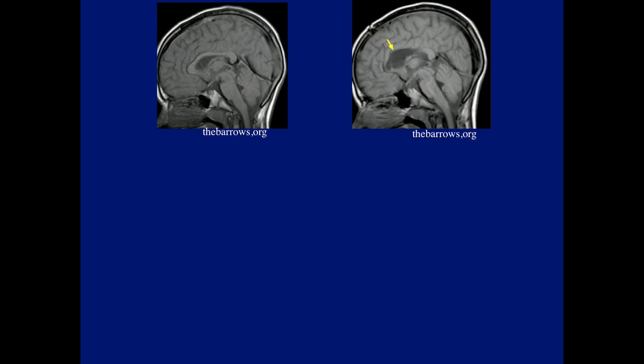What was performed here? Not a lobotomy. Lobotomy is removal of a portion of the brain. Something was removed, but what is that called? No, not a shunt. Correct. As our resident said, there was a callosotomy.